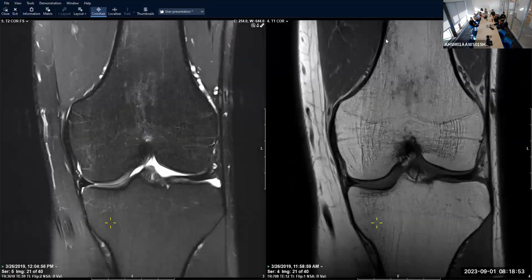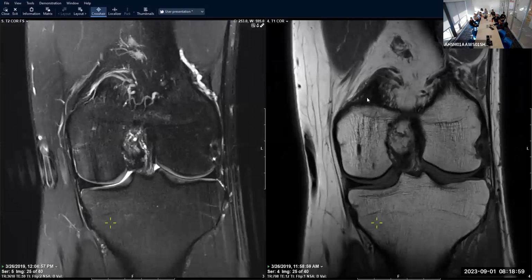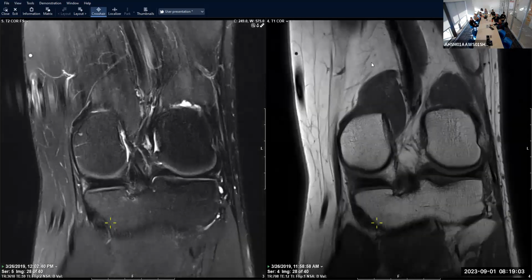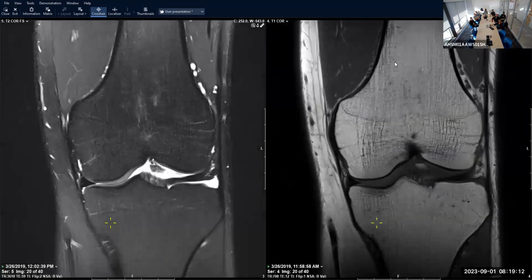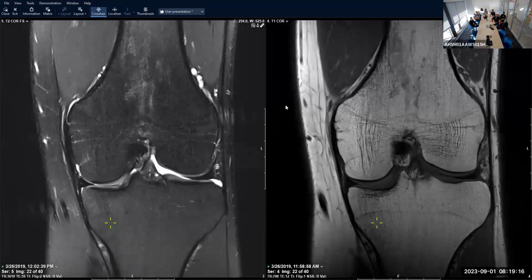They're usually cortically based, eccentric, well circumscribed, and bubbly, lucent appearing, on X-ray and on MR. Some people will just ignore them because we don't want to freak anybody out, but I usually interpret them and put it in the body of my report, not the impression, just so if anybody has a question about it, it should be there hopefully.